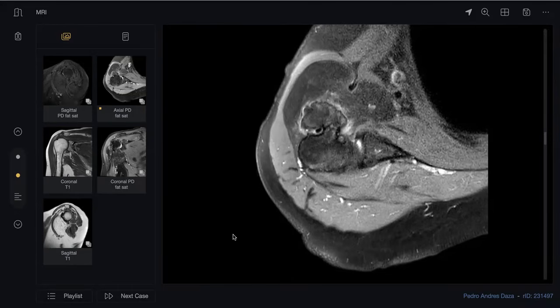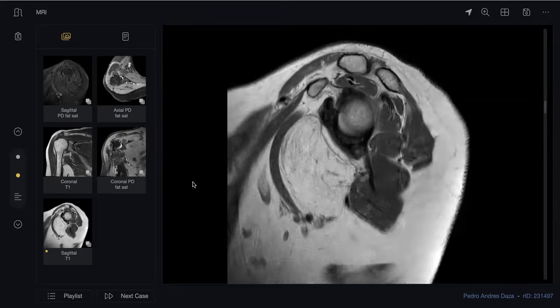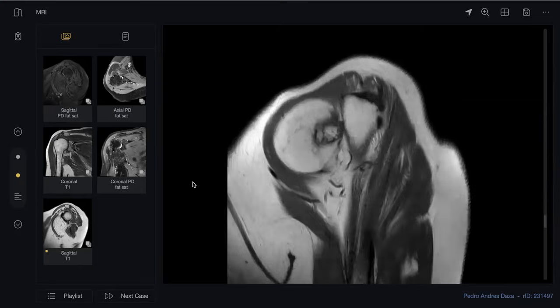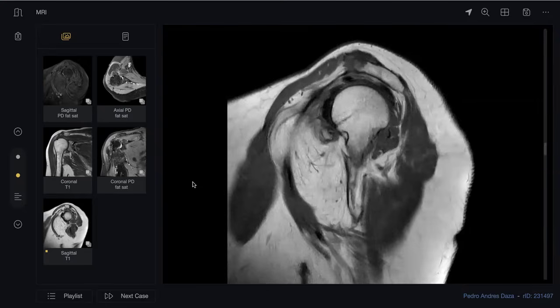Okay, so there could be two pathologies lying side by side. If this is osteochondroma, what is this? Could be something related to the synovium. Take a look at this. Okay, it looks like that. So it's an intramuscular lipoma. Yes, so there are two pathologies here.